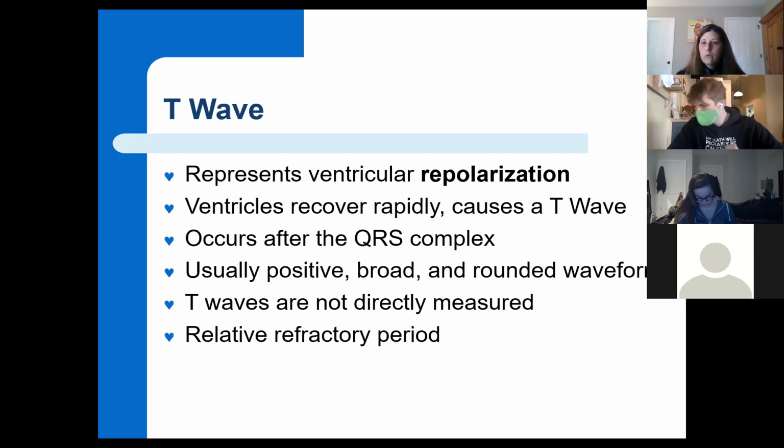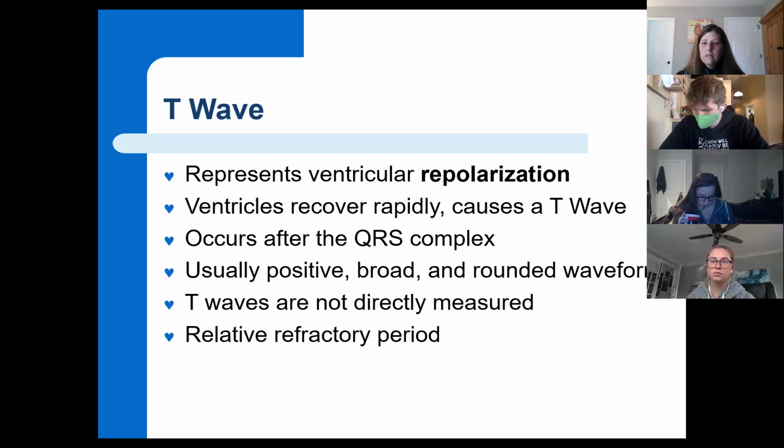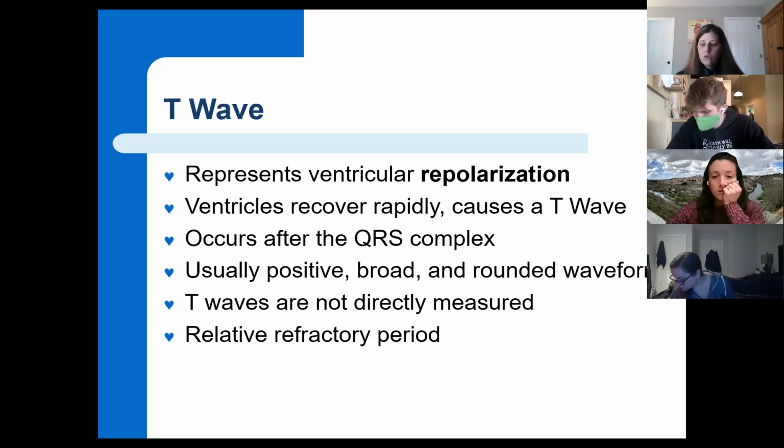Now, as I mentioned earlier when we were talking about why can't we see the repolarization of the P wave, you know, because it's hidden somewhere in the QRS. If you have a QRS, you have to have a T wave, okay? Sometimes people will confuse the T wave with the next P wave, but just be very careful. At the ventricles, those two larger chambers of the heart, if they contracted and you had a QRS, you have to have a T wave. It may not be as beautiful as the ones I've shown you, but it will be there.